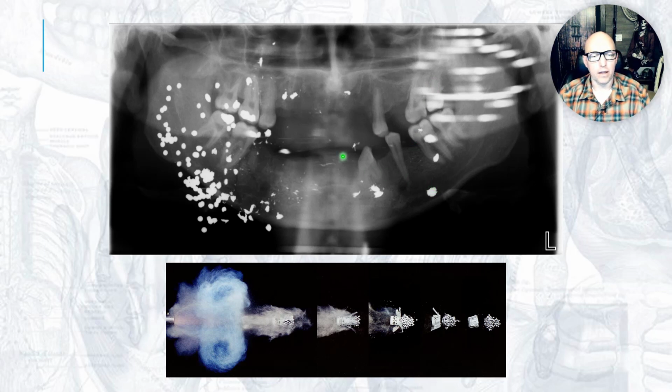Real images more likely to be in that focal trough and in focus, ghost images stretched out. And so what we're seeing on the left side, overlapping the patient's left side, is ghost images of all these pellets over here. And yeah, maybe they have some scatter, some real ones, or maybe these are just projected in a way that they are real or that they stay in focus. But yeah, largely you can say the damage is done here. Obviously on the right side, very in focus, nice round pellets for the most part. Some of them look like they broke apart, got a little debris. Maybe some of that is amalgam fragments, but no fun for.